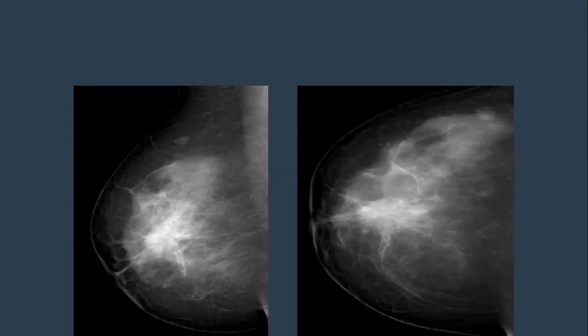The focal asymmetry density. We call it focal asymmetry. Yes, it is associated with focal asymmetry. There is an area of distortion associated with focal asymmetry and nipple retraction or subtle skin thickening, periareolar skin thickening. Yes, also there are intramammary lymph nodes. Okay. Yes, the upper outer. I don't know exactly its status, but I cannot read it more than that. It's okay. So what is next?